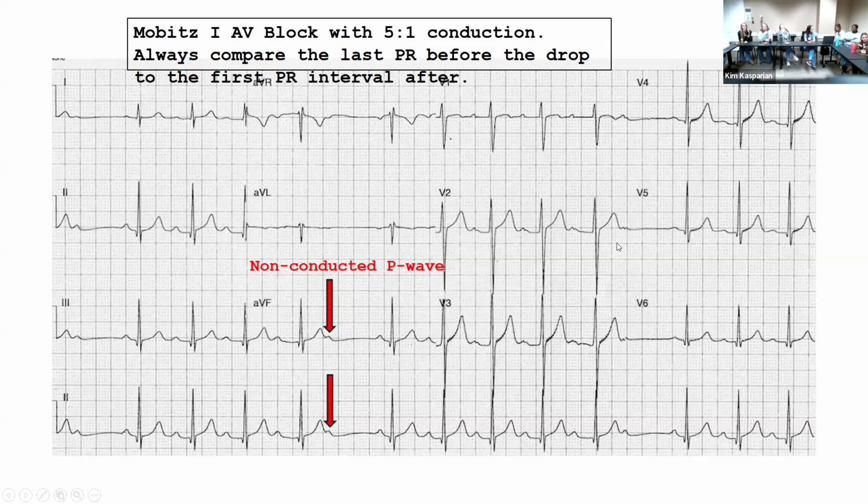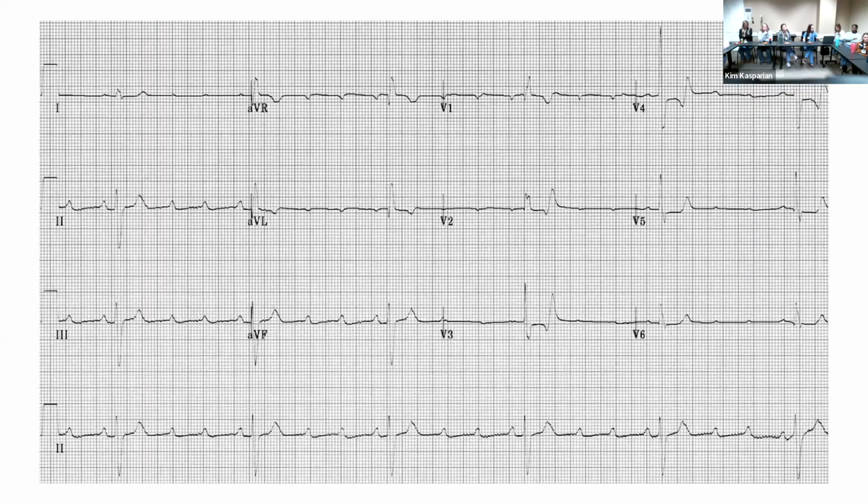Especially on a 12 lead, you might have trouble. So that's when you go to the telemetry and you can look at a much longer segment, and then you might be able to capture it. Oh, this one did not come out very clear. So this one's a little sneaky.